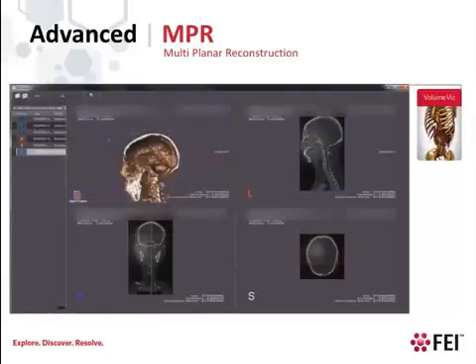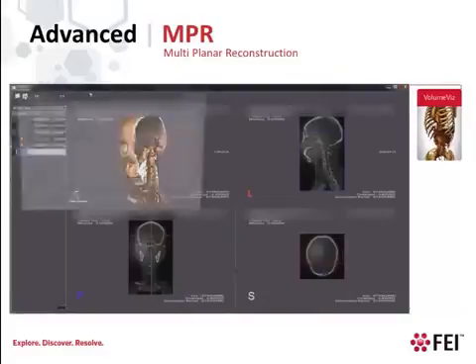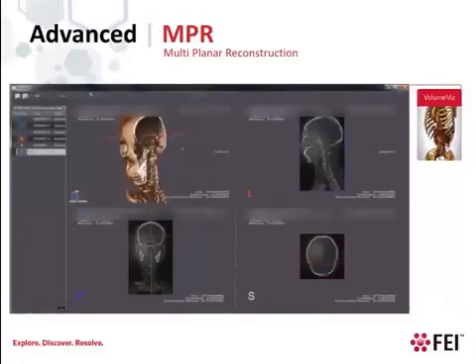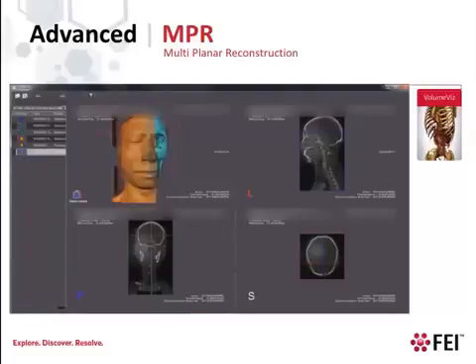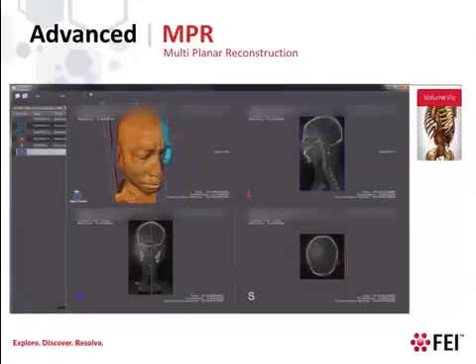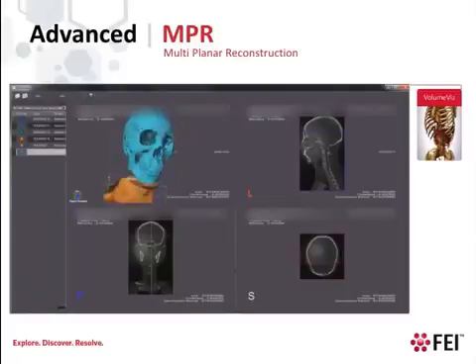In addition to combining multiple volumes, it is also possible to combine volume and geometry rendering. Let's import a previously extracted isosurface representing the bones of the skull. Now, by changing the minimum and maximum values for the data range, we can change the rendering and see the skin. Again, by using the region of interest manipulator, you can clip the volume rendering. This volume clipping does not affect the geometry, although there are separate clipping operators that we could apply to the geometry.